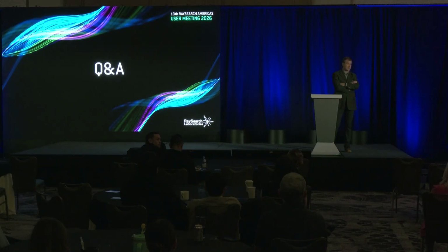So this segmental approach is, I think, why the trial used it. The beam-specific objectives don't really drive anything other than the need to verify that they still meet the per segment dose, the pulsing dose. So you want to verify that every beam covers the target, covers the target without producing large hotspots within the target, and delivers the pulsing dose of 0.2 gray inside. And that's actually pretty straightforward to do with the restrict all beams individually. That tool is fantastic.